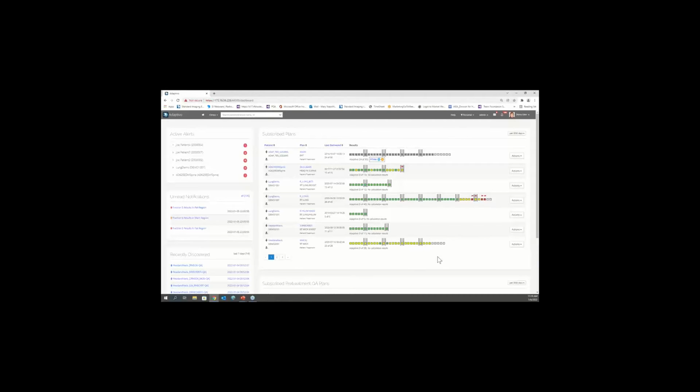And then here on the right is more information. If you'd like to look, you can see this is the particular demo lung case that I was giving background for. What you can see along here is each fraction: fraction 1, 2, up through fraction 30. For the first 30 fractions, the chiclets, as we call them, are green, meaning that there was a good gamma comparison, so the gamma was in the pass range.